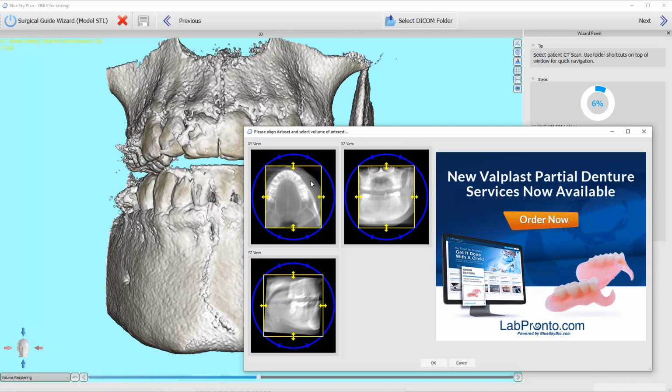This is our opportunity to fix it. Take advantage of that opportunity. Okay, so we have to fix this, and do any sort of other rotations that might need to be done. Don't worry about cropping it. Usually that's sort of irrelevant. If you're using a really low-powered computer, maybe you want to reduce the data set so it's not having to process as much. But for the most part, just keep it the same way. Rotate things so that they look good, and then move forward.